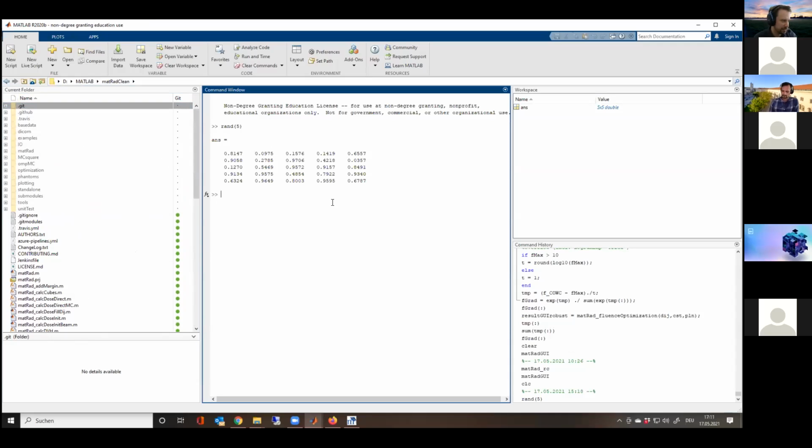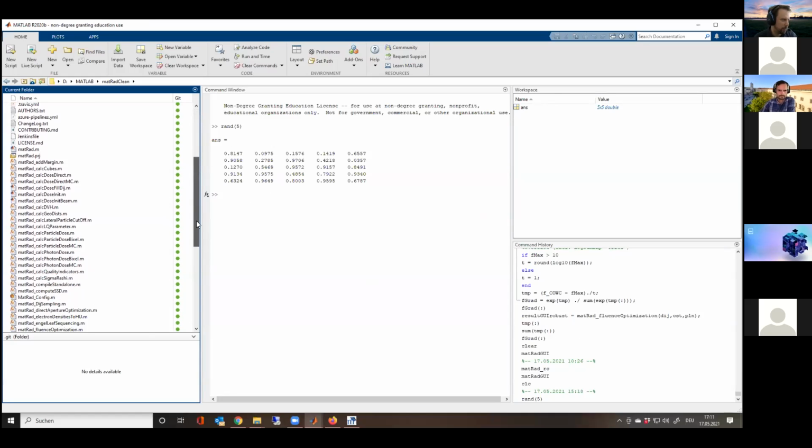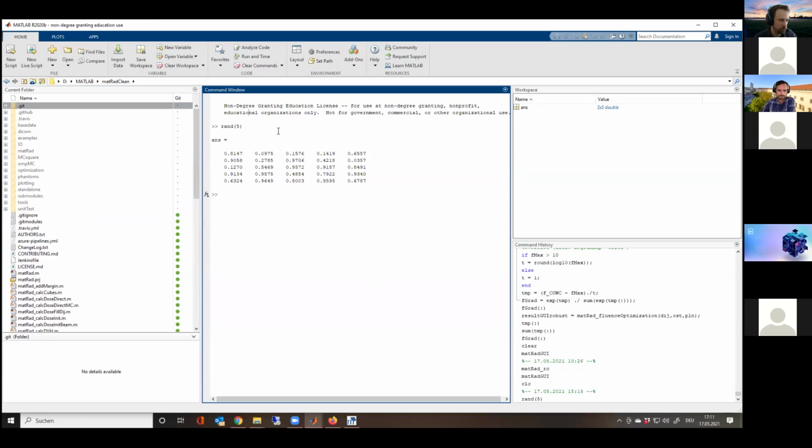And just once more, to make it clear to everybody, this is the setting that people see that use the code. Okay, you as users of the standalone, or those among you that use the standalone, you will never see such an environment. You will never work with this. The only thing you will see is the graphical user interface. And what you do with the code to start the graphical user interface is basically you use this command window to issue the commands for it.